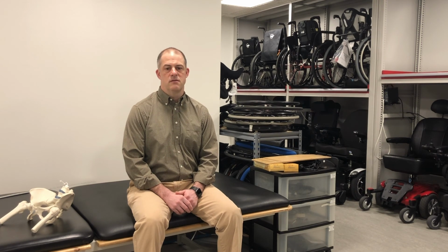Finally, I provided a video using the lightboard system, essentially a translucent whiteboard, to demonstrate how you can quickly and easily model this pelvis, spine, and lower extremities. The models will help you better understand the impact of gravity on an individual's posture and begin to identify seating systems that will support an individual for increased function.